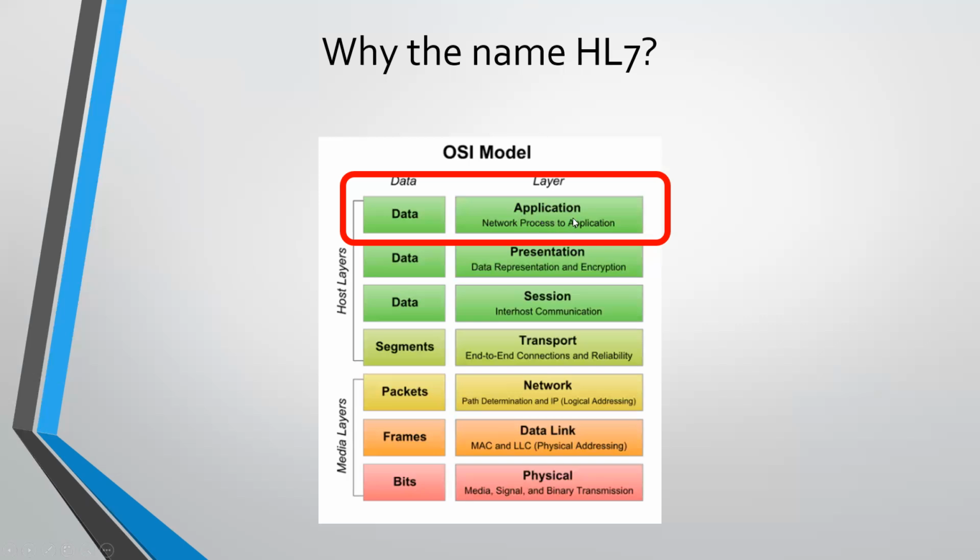So this is an interesting concept you can go through in detail. Not very much needed for us. I just wanted to let you know its functionality. How is it related to HL7?